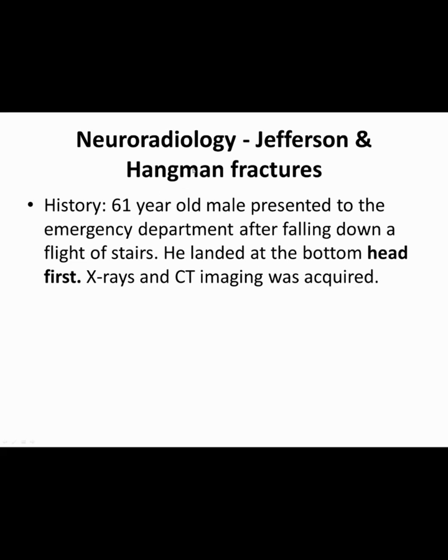A 61-year-old male presented to the emergency department after falling down a flight of stairs. He landed at the bottom head first. X-rays and CT imaging were both acquired. So what's important from this stem here is that the patient fell head first. When you fall in that manner, it causes an axial force of compression that can lead to a burst fracture of the atlas, also known as a Jefferson fracture.